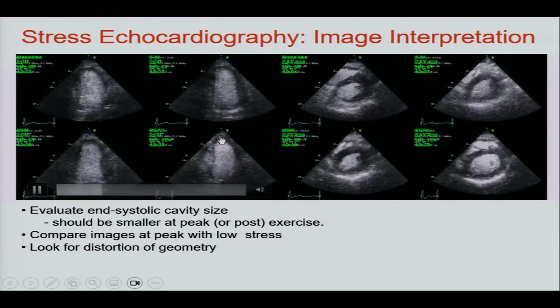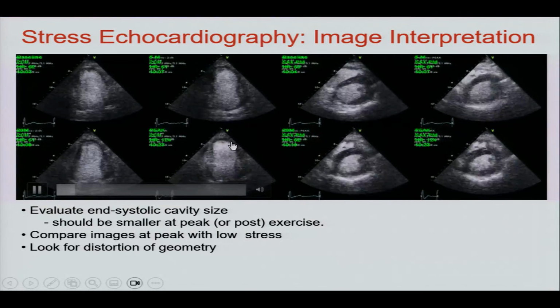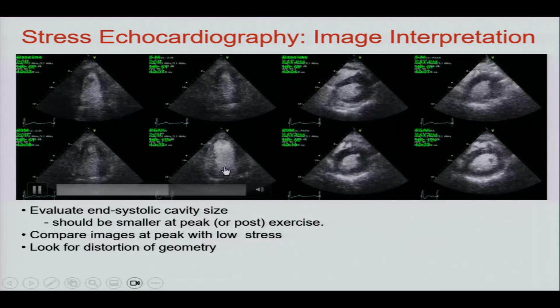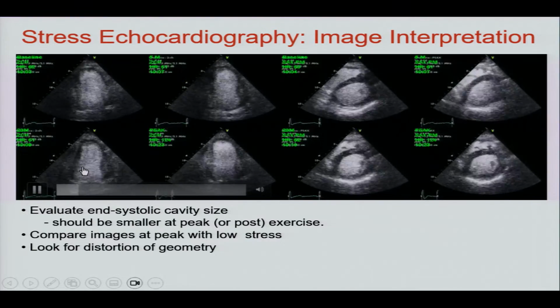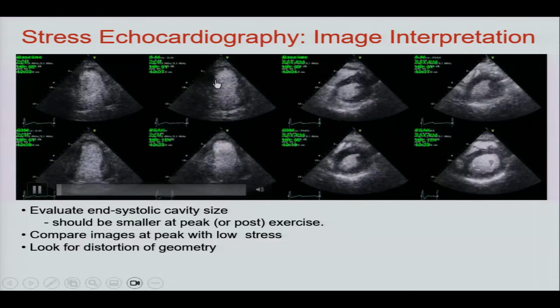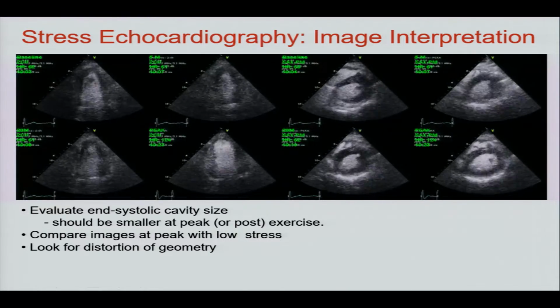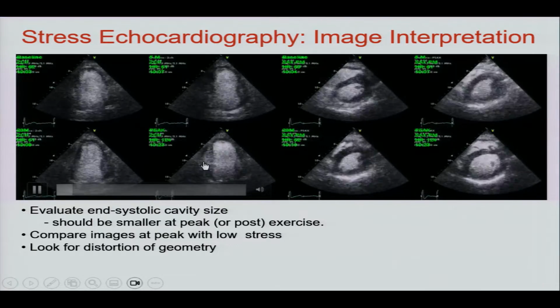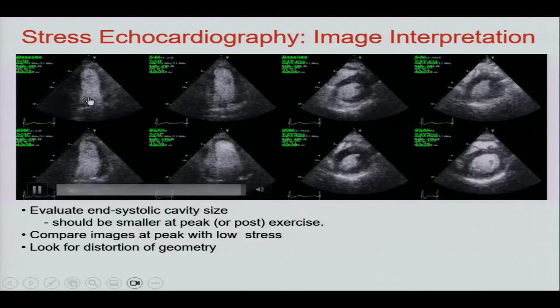Yeah, when you look here, it looks like the whole end systolic volume has kind of gone up. Now, compared to there, look at that. And this one here too. So again, this comparison is a lot easier to recognize than this comparison, because this might start looking more like resting.